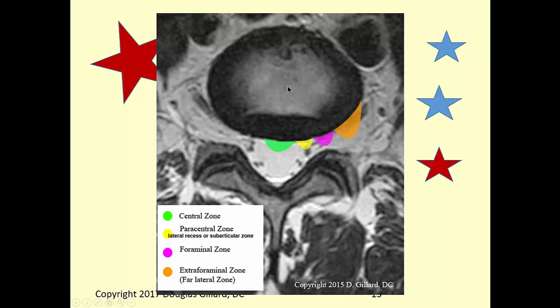Now, I'm going to teach you this on the MRI for real, but we'll cheat a little. This white stuff is a T2 weighted image. Nucleus pulposus. Annulus fibrosus is in black. So where's our four? These are kind of covered, but we can see two. Let's do this one. This is the L4 disc. Who's that? That's the L4 exiting root, just a piece of it. Remember I told you we see pieces. We don't see it like I drew in the cartoons.